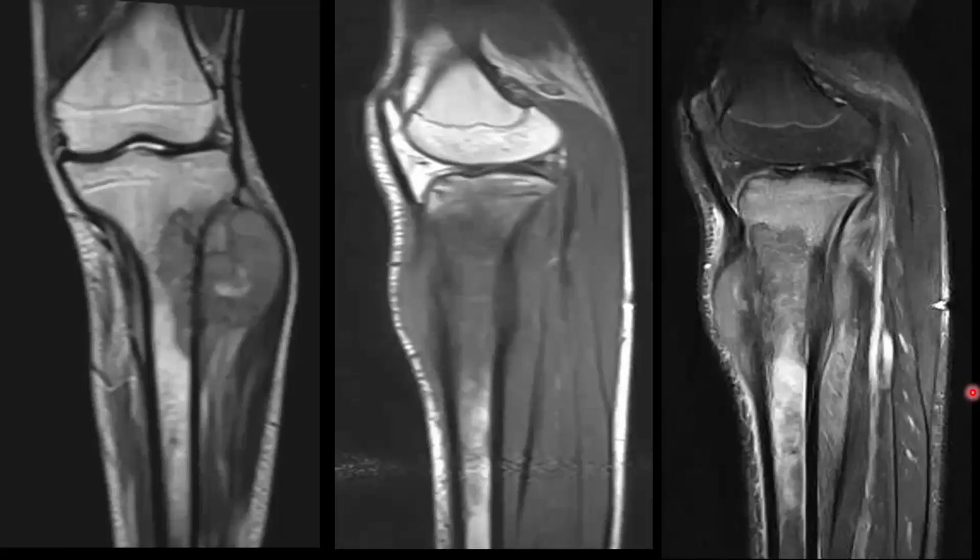If you see the MR, the picture is different. See that a huge soft tissue mass lesion is there. It causes eccentric irregular osseous destruction of the tibia. This is isointense on T1 MR images. It shows a soft tissue component. See that the medullary extension is very extensive, extending up to the mid-third of the tibia.